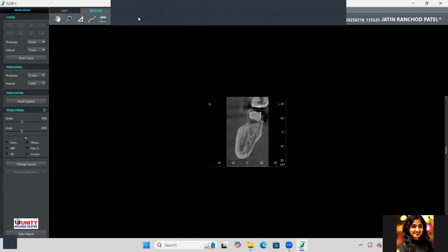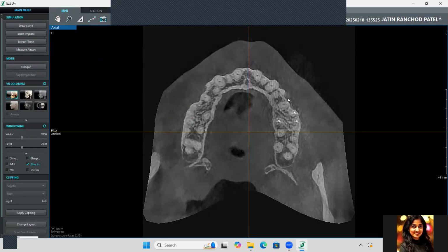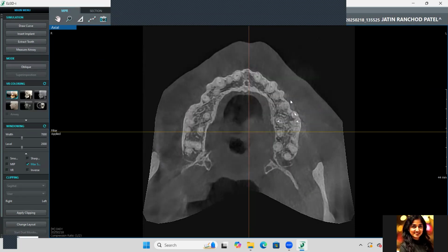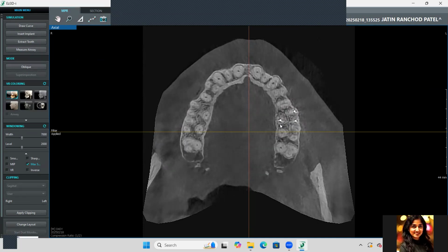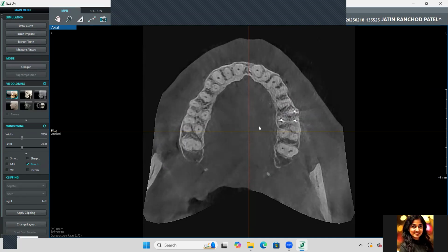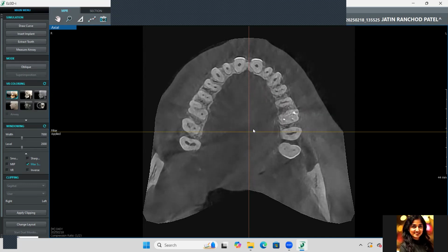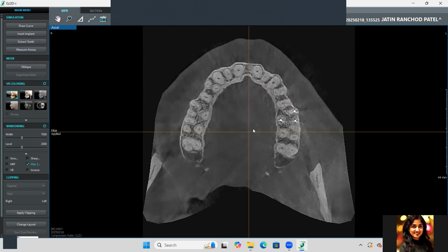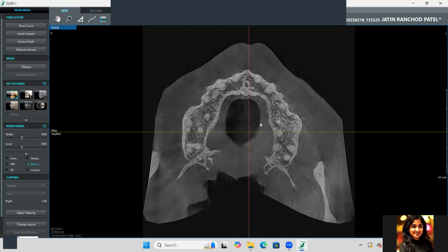This is a root canal treated tooth. Sometimes, because of excessive preparation, a vertical fracture can happen, but I don't think this case has a vertical fracture. It is very close to the periodontal ligament. I think the endodontist must know it better, but it cannot be a cause of pain. I thought it was nicely done as per the CBCT.